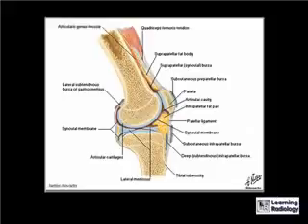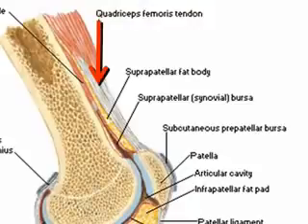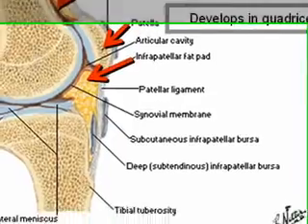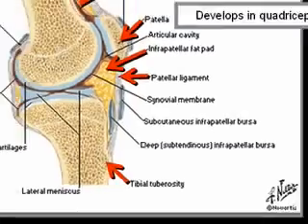In the lateral projection, the important anatomic considerations are the quadriceps tendon, fat that lies immediately posterior to the quadriceps tendon in the suprapatellar fat, the region of the suprapatellar bursa, which communicates with the joint space, the patella, which develops in the quadriceps tendon and is a sesamoid, the infrapatellar fat pad, called Hoffa's fat pad, and the patellar ligament, which inserts on the tibial tuberosity.